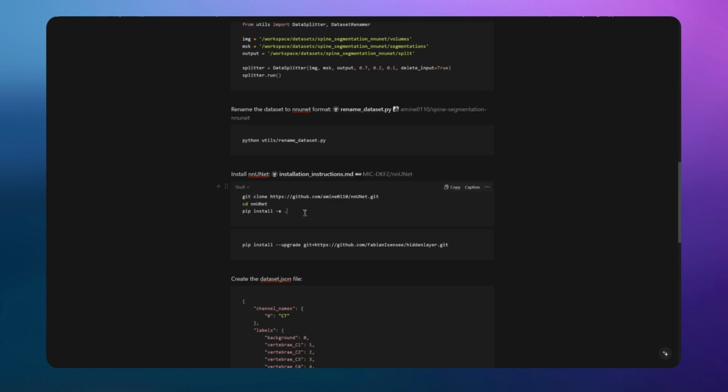For a very big reason: the nnunet team builders, or the owners, are all the time doing some updates, and sometimes just one update can affect the whole workflow. So what happened to me, for example, I had some models that had been trained, and when I wanted to run those old models with the new inference code from nnunet, I couldn't, because the structure was different. And the same thing for the training.